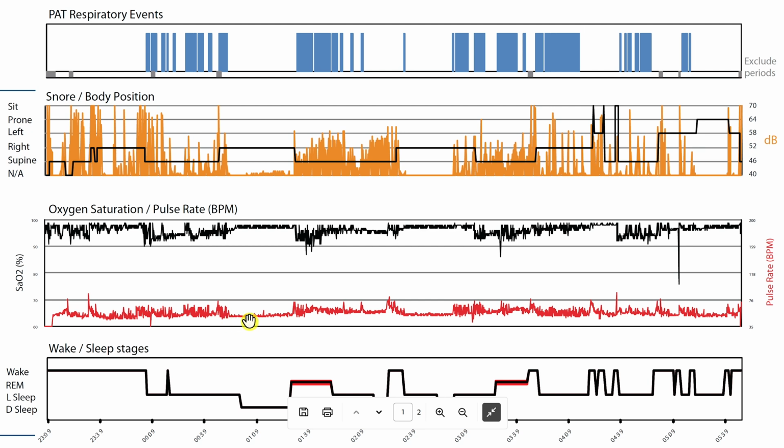And you can see, for example, here, there's very stable heart rate. And then you see some variability and it's sporadic. Same here. And then you have stable, stable, stable. Now, as I mention all the time, we do expect heart rate variability to go up during REM sleep. It's normal. And you can see that most of these values fall between 35 and 76 beats per minute. There's nothing that gets too crazy, like up above 100, because the unit's here on the right side.